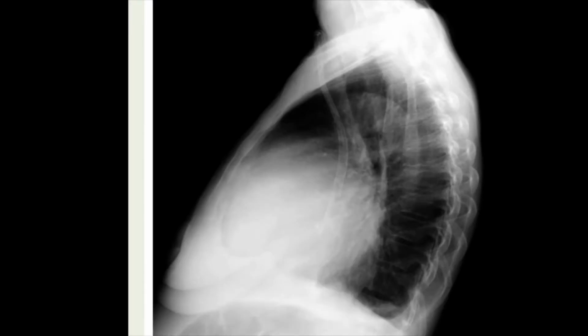This is a lateral chest radiograph, and the pertinent finding here is this little curvilinear lucency along the heart contour. And this is the oreo sign, or the sandwich sign, and it signifies a pericardial effusion. Here, this opacity, this is the heart. This little curvilinear lucency represents the epicardial fat, the pericardial fat, and this over here is the fluid within the pericardial cavity. This is a pericardial effusion.